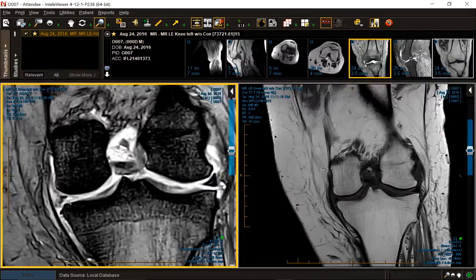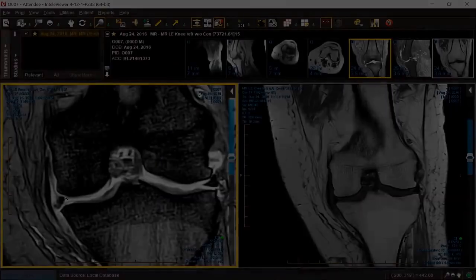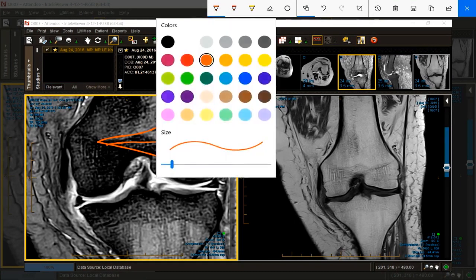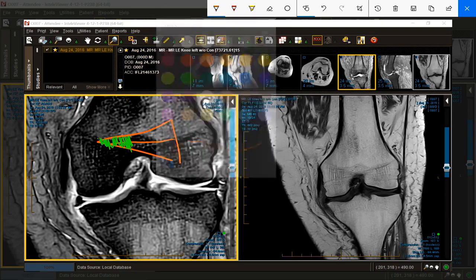So what about my poor little squiggly meniscus? It was resected. And when you resect the meniscus, you lose the tether. You lose some of the anchors. And that's what's happened here. Now here is another concept that's very important. You take a meniscus tear and you chop it. The surgeon comes in and they chop it because it's symptomatic. And they chop it and they chop it and they chop it and they say, you know what? Now the meniscus is starting to get kind of vascular. I think I'll stop, even though there's some signal remaining in the meniscus.